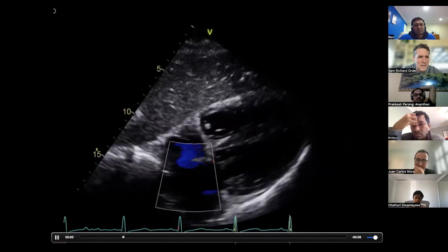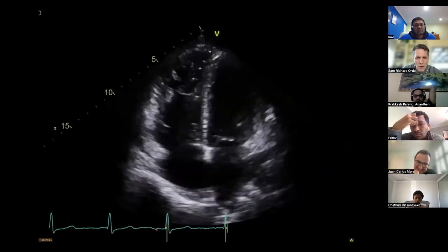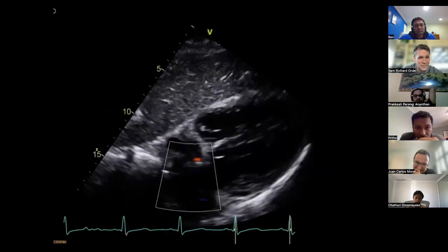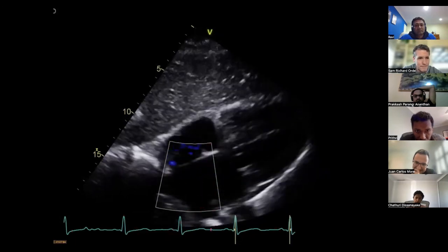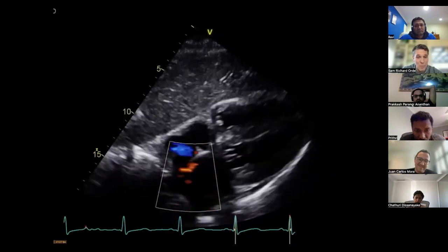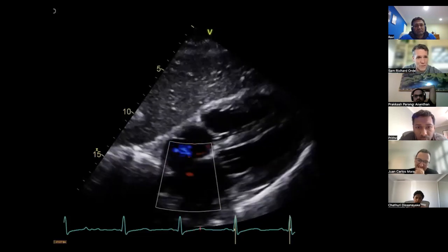You were bloody close. You told me before that you thought the right atrium was dilated. What color would the flow be if it was a left to right shunt? It would be red. So I think that's probably why I put that in there, just to try and nudge you in that direction, and you got there all by yourself on the slide before.